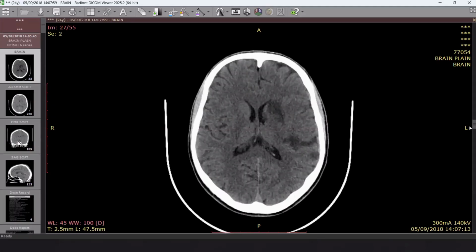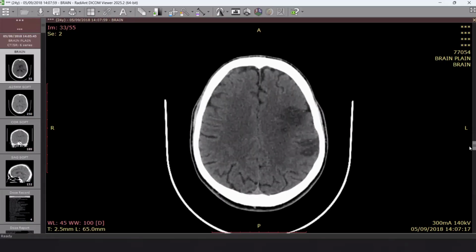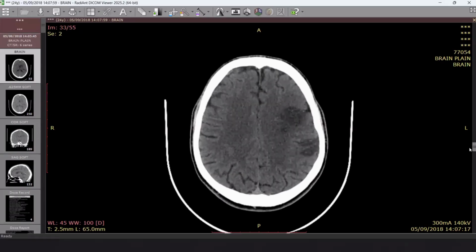You are doing very well. You are going straight forward to the diagnosis. How can we confirm? What should we search for in any stroke patient? We don't have any hemorrhagic insult. The insular sign. Do you mean insular? We should search the blood vessels, the middle cerebral artery, for any acute signs of cerebral infarction.